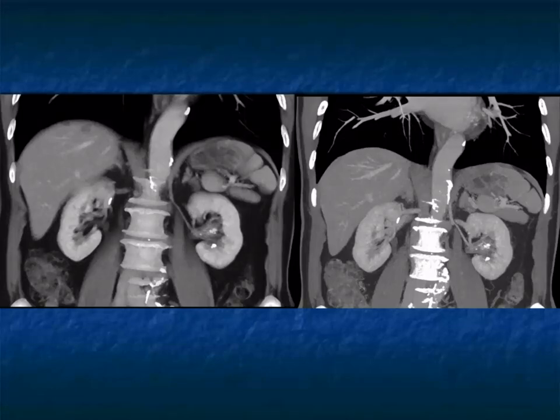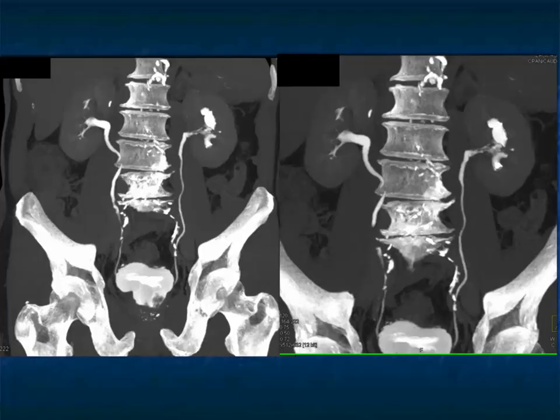But as you look at the venous phase, you can see the infiltration of the pelvis in the left kidney with the calcifications. And on excretory phase, you very nicely see the distortion of the pelvis, the infiltration, very classic for transitional cell carcinoma. This also emphasizes the point we've made many times, how MIP imaging is very valuable in looking at the kidney.